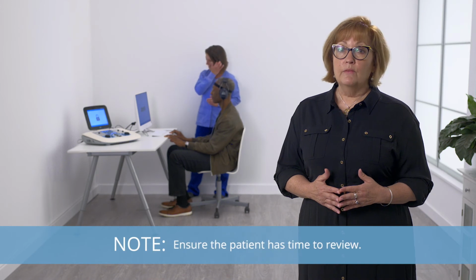The instructions will be displayed immediately before the AMTAS evaluation starts. If the test instructions are displayed, ensure the patient has time to review them before he presses Continue to the test. If the video instructions are displayed, AMTAS will begin testing automatically at the end of the instructions.